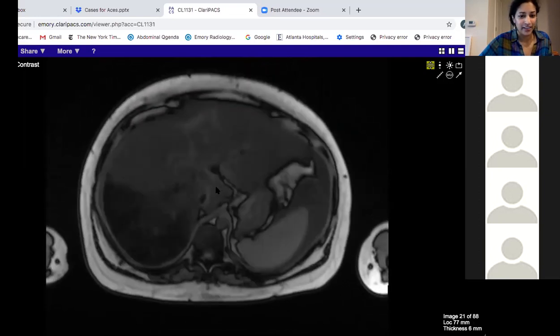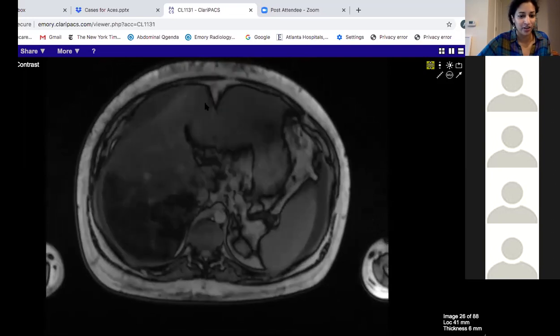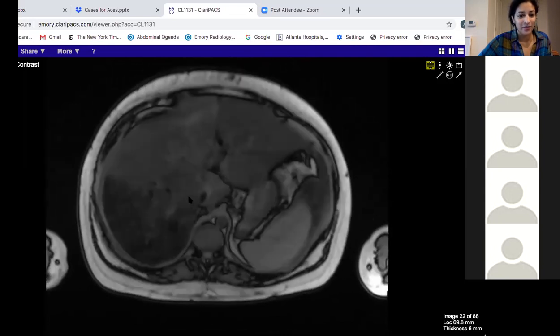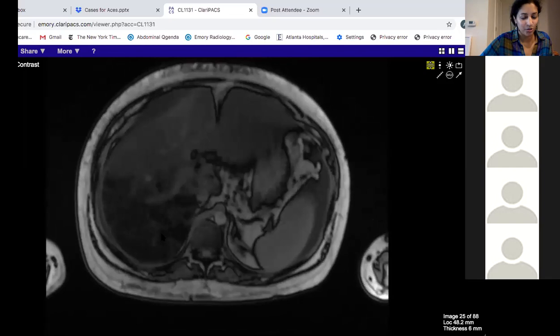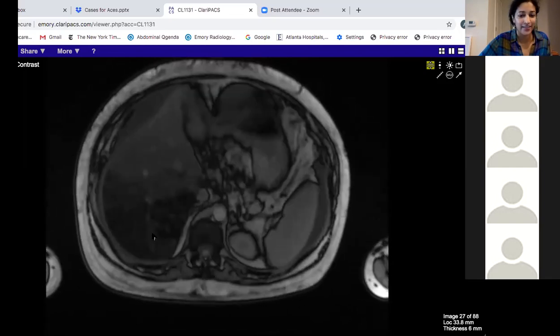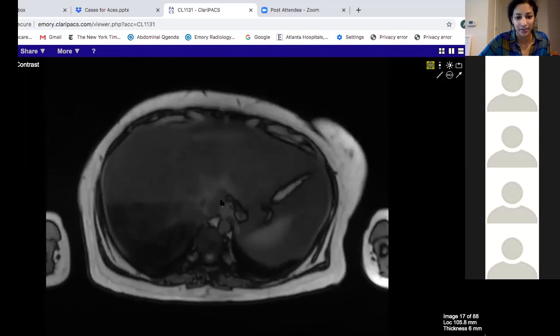It usually can be diffuse, or if you get focal fatty infiltration, it could be along the gallbladder fossa, porta hepatis, subcapsular areas. But sometimes it can just be very geographic like this. So on CT, you could be fooled into thinking that the liver is hypoenhancing, but it's actually just fat. If you don't have a good enough phase, always just get a later phase or an ultrasound and make sure that you're not overcalling Budd-Chiari.